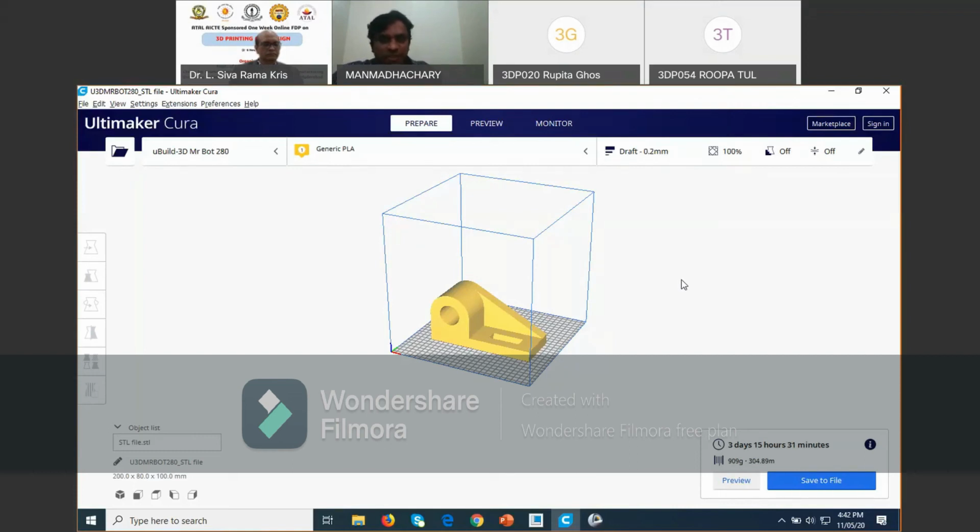Any doubts? Any queries regarding now? After saving, it is finished. That file you can send to your 3D printer. Nilesh.